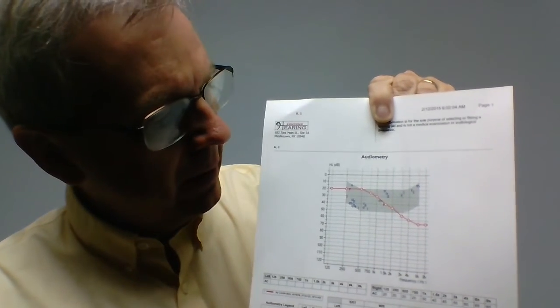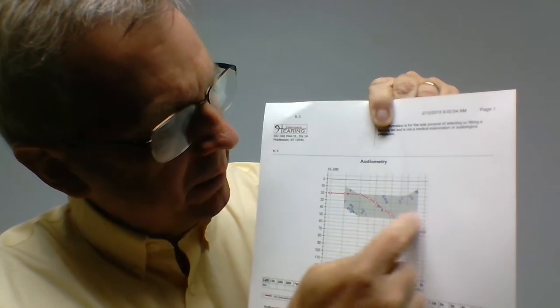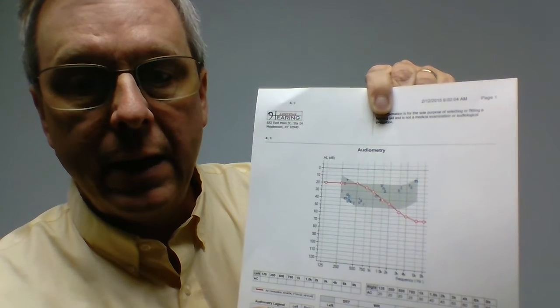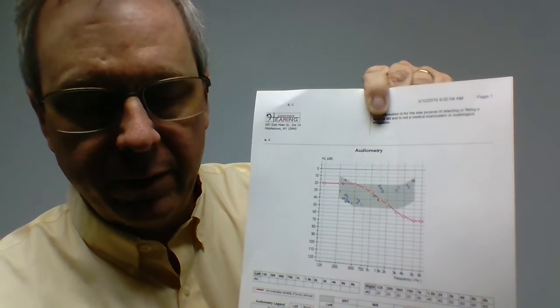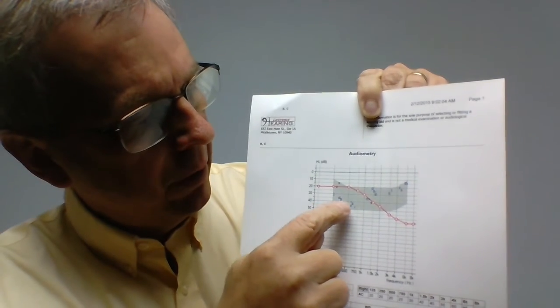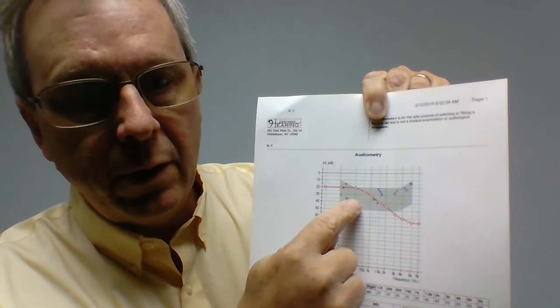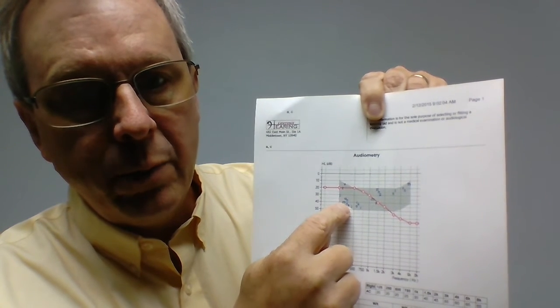And the easiest thing for people to understand, I think, about a hearing test is having this box here, because in the box you'll see letters, and where those letters are represents where those sounds are in normal average human speech. Okay, so when I am talking, the sound of an m, d, b, those low tones are right here. And this particular guy hears these low tones very well because he can hear the low frequencies way up here at the top. So because he hears the lows well, he can hear those letters really well.